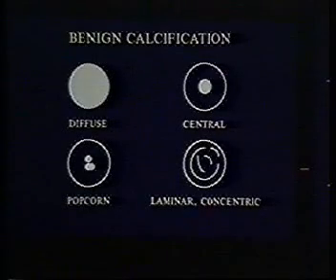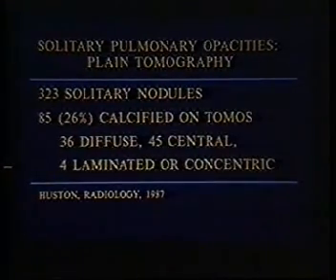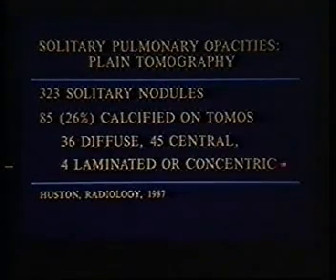In a series of solitary nodules that showed calcification on plain tomos, we can see that diffuse calcification and central calcification are most typical, and laminated or concentric calcification is much less common.